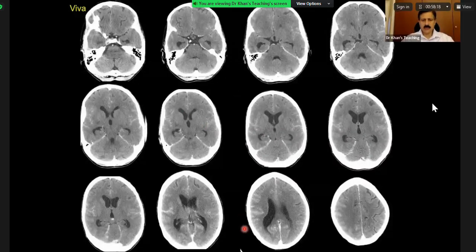Okay, I'll take over because of the time factor. This is a very, very good case, and these kinds of cases have come in the exam quite a few times. My own SPRs have got them in the past. Basically, what is happening here is that there is no subarachnoid hemorrhage, there is leptomeningeal enhancement. And it's bilateral symmetrical. And actually, the key thing is look at the basilar artery, and then you understand that this is with contrast. Basically, I just put it here just as a trick case. But in the exam, the same thing will happen. So don't jump to conclusions.